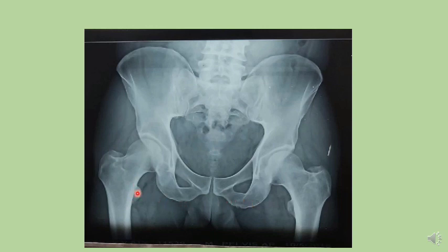And this is lesser trochanter, greater trochanter, neck of the femur and head of the femur. And you can see medullary cavity and the cortical dense bone. So these are the few points you might have to pick up. And if you answer everything, there are certain other things to be answered for your examiner. These shadows, these are black shadows of gas in bowel intestine.